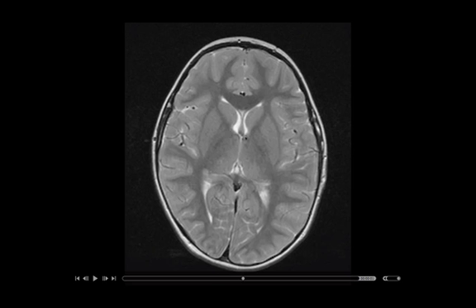Next, we have the third ventricle. The structure here is the third ventricle. On either side of the third ventricle, the structure is the thalamus. So there's the thalamus. And then going further down, this is the occipital horn, also known as the posterior horn of the lateral ventricle. Moving on.